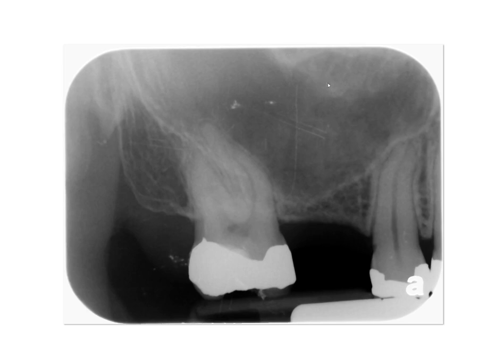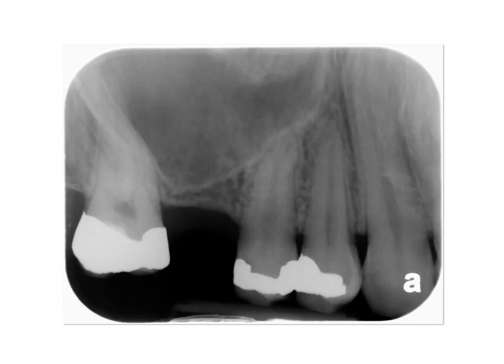And again, it's a little bit difficult to say precisely which one of these is the zygomatic process of maxilla and what is the part of the zygoma, but we do see that opacity, and it's one of those two structures that I mentioned.